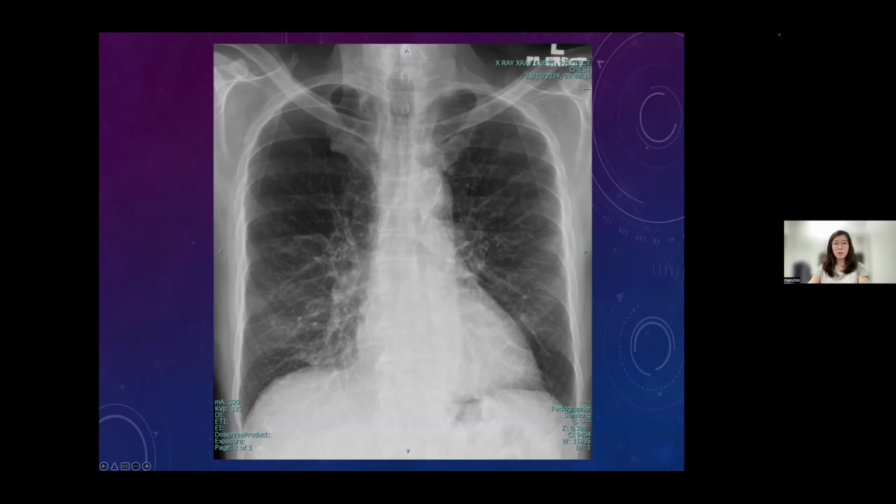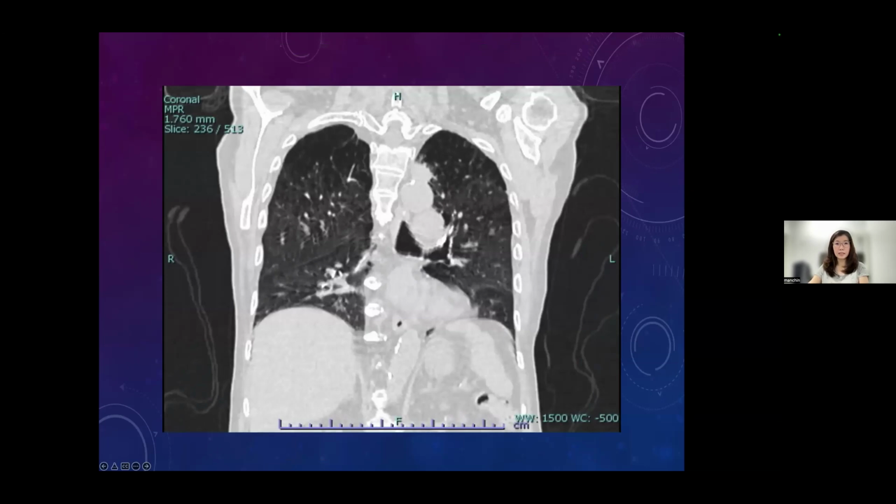Okay. So for juniors, normally the patient will come to see you first, and then you order an X-ray. You may be the one who first looks at the X-ray. So it's very important for you to scrutinize one by one, and if there's any small opacity that you're not sure about, that raises suspicion, please go ahead and do a CT scan. Even a plain low dose CT thorax, then you can already detect the lesion. If not, we will miss this size of quite small primary lung tumor, but it will progress very fast. Okay, so next, this is a CT of the same patient showing there's a mass above the aortic knuckle here. Okay, so next.